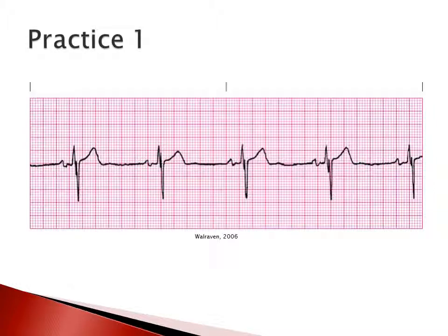So now that we've discussed normal sinus rhythm and some of the sinus node arrhythmias, we're going to practice our interpretation skills over the next 4 slides. And this is going to help prepare you for your practice when you're analyzing rhythms for your patients who are on telemetry. So we'll go step by step through the practice strips and keep in mind our normal values, and we'll determine what rhythm each patient is experiencing.